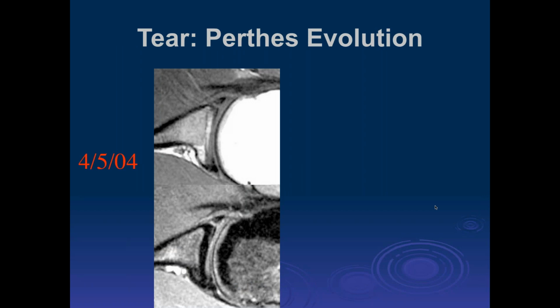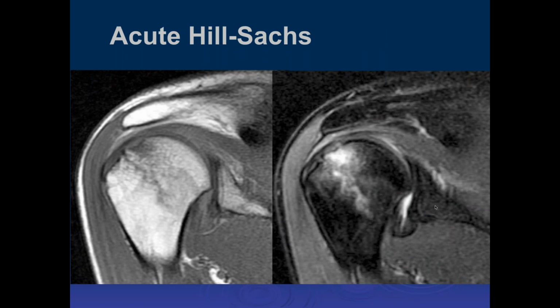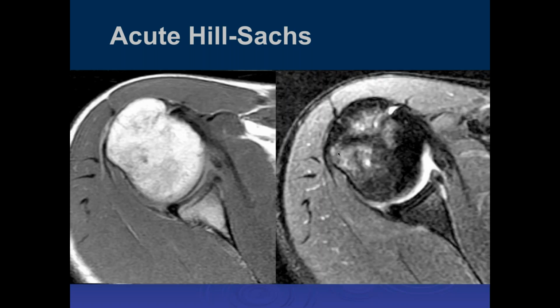Okay. And that last one was a subluxation, was not a dislocation. No Hill-Sachs. Wait. This one right here? This one? Yeah. I'm trying to figure it out. Yeah. There's no Hill-Sachs. Yeah, there's a Hill-Sachs. This is a big impaction injury right here. Oh, okay, got it. Yeah, and then there's also a little bit of edema of the glenoid here as well.